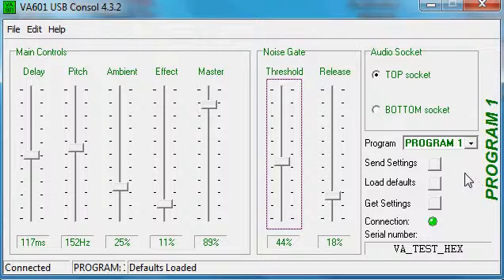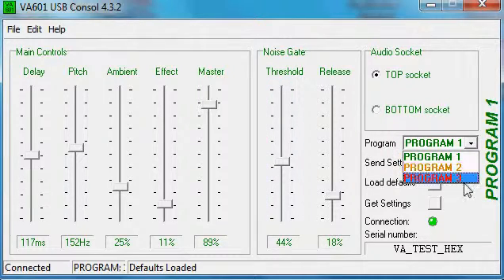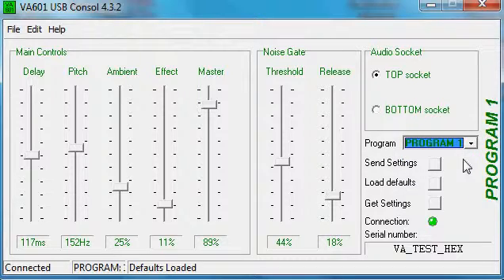And a very important part of the control panel software is the program selector. This selects a range of settings across all of these parameters that is stored in a group known as program 1, 2, and 3. On later models, a fourth program has been added for the masking function. They all work in exactly the same manner.